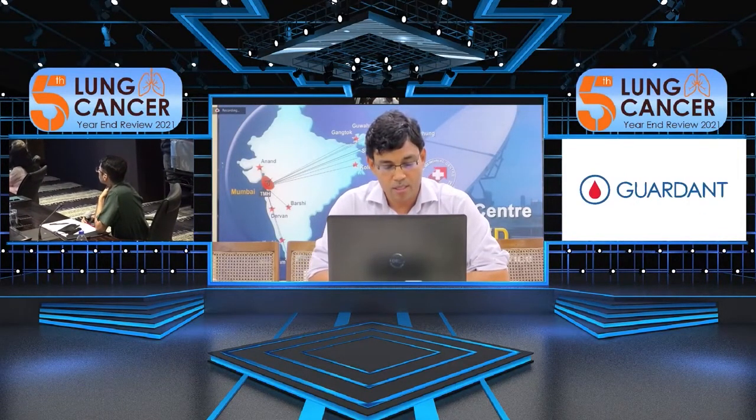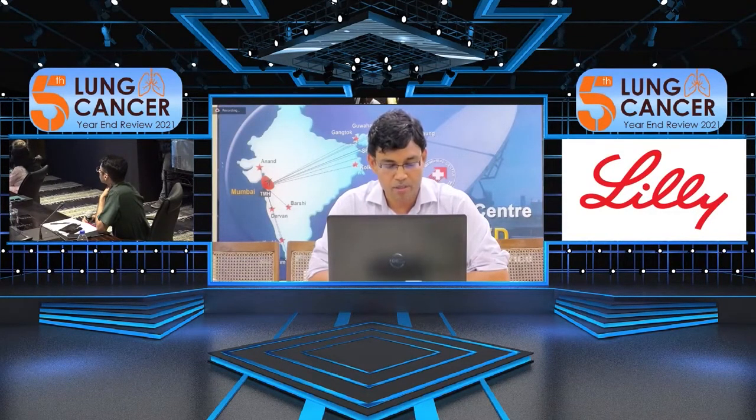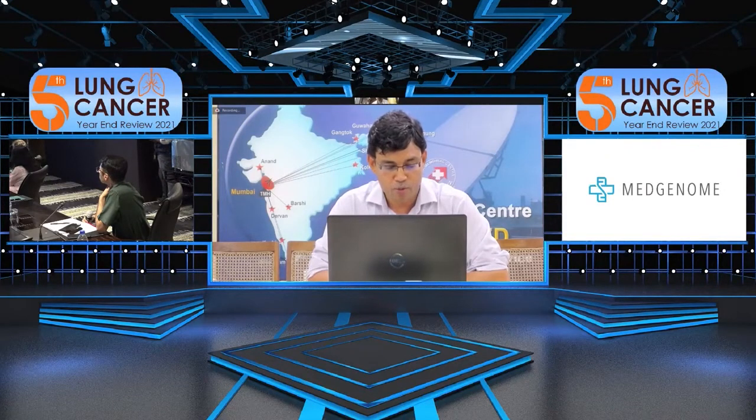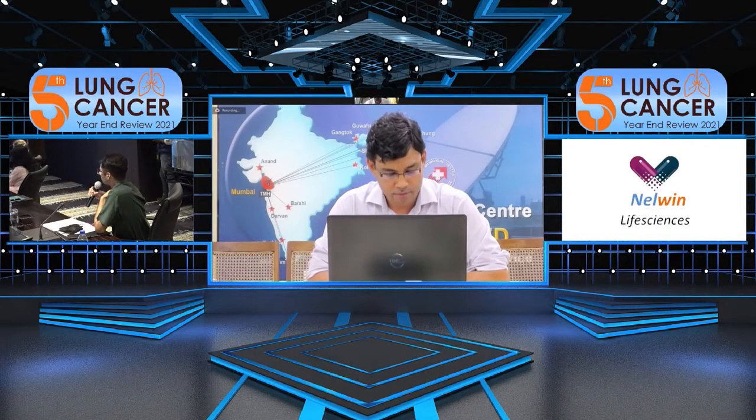So this is the most important sequence. Without contrast, one should not comment about whether this patient is harboring any metastasis or not. So MRI has to be done with contrast. So we should mainly focus on T1 plus contrast. Yeah. That would be it. Okay.